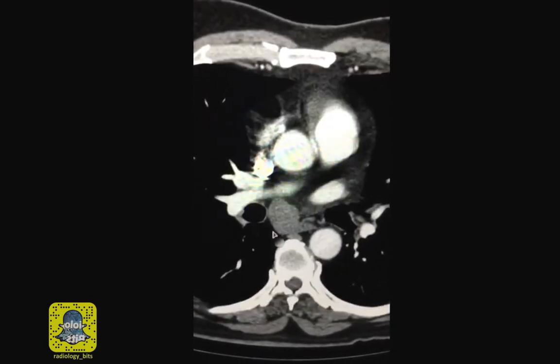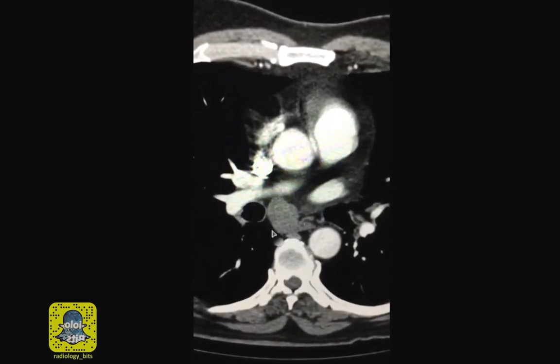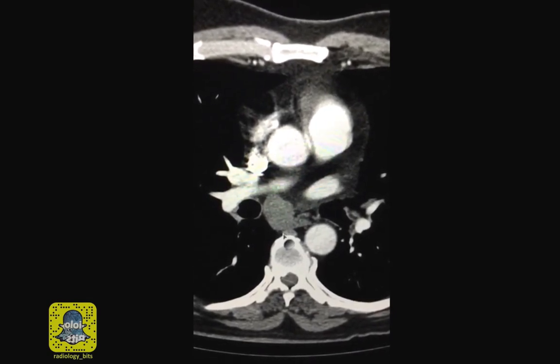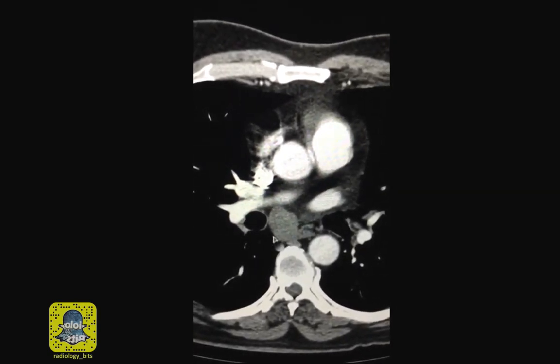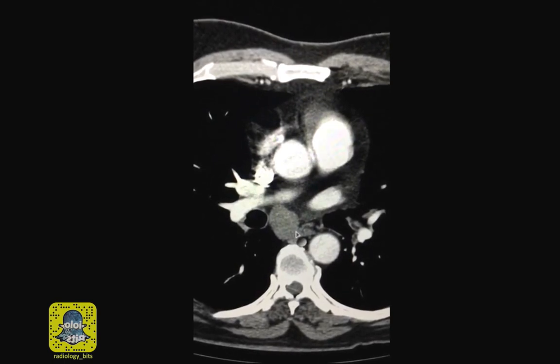Another cystic mediastinal abnormality in endemic areas would be an infection known as hydatid cyst. There are many features of a hydatid cyst, none of which are seen here, but the commonest would be a multiloculated appearance, or a large hydatid mother cyst with daughter cysts arranged along the periphery. Again, something that we don't see here.